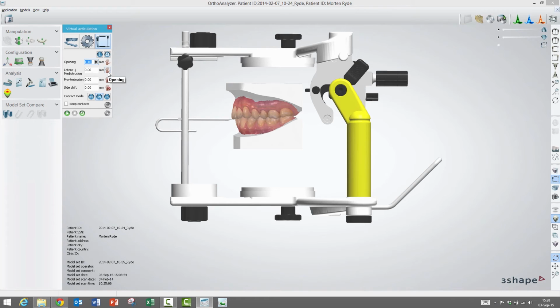If you want the translation movement to go not further than a certain value, then you can set the value here in order to make sure that it doesn't exceed it. This movement can also be locked and unlocked at will, depending on what you are trying to perform. So when you click the little hand and there's a stop sign over it, it means that you have locked this into the constraints.